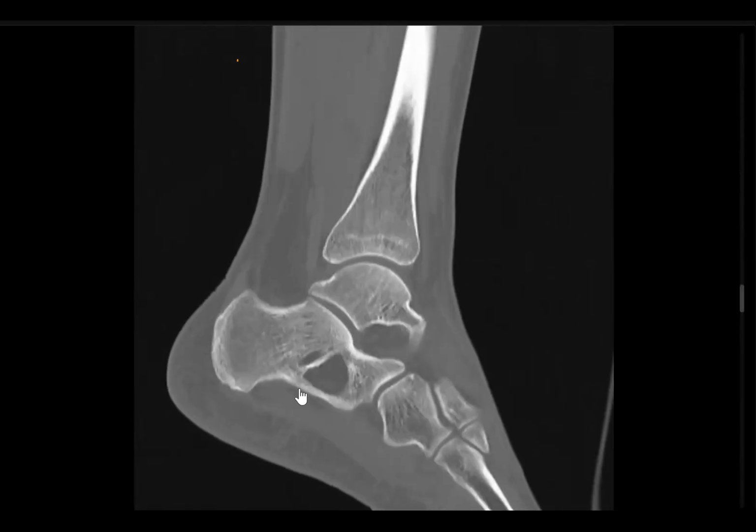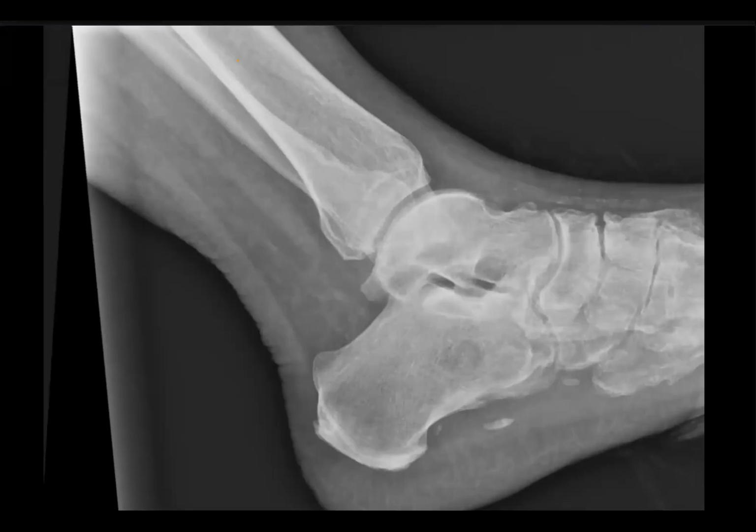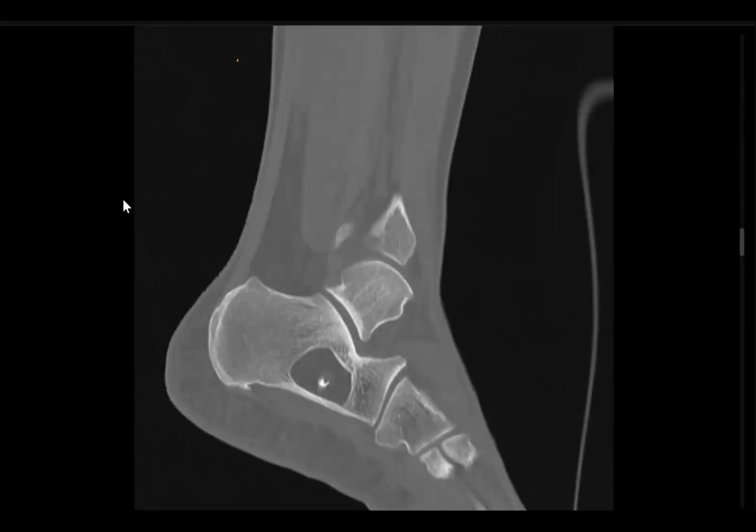Okay, and this is the equivalent CT. So just to revise, my friends, there is an area in the calcaneus which may show defective trabeculation. This is normal. It's called pseudo lesion or pseudocyst. If it is well defined, then it's a lesion. The commonest one here is simple bone cyst. The second common is lipoma. Lipoma may be like simple bone cyst or have very characteristic central calcification, Cockade sign.